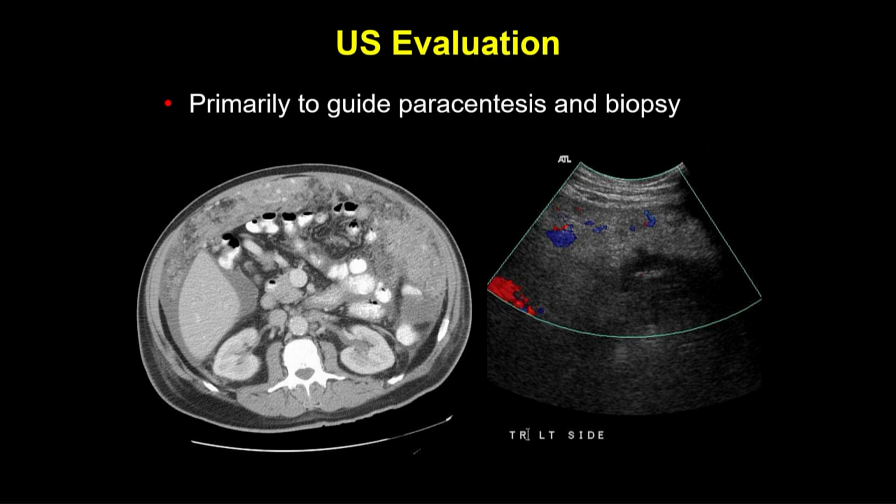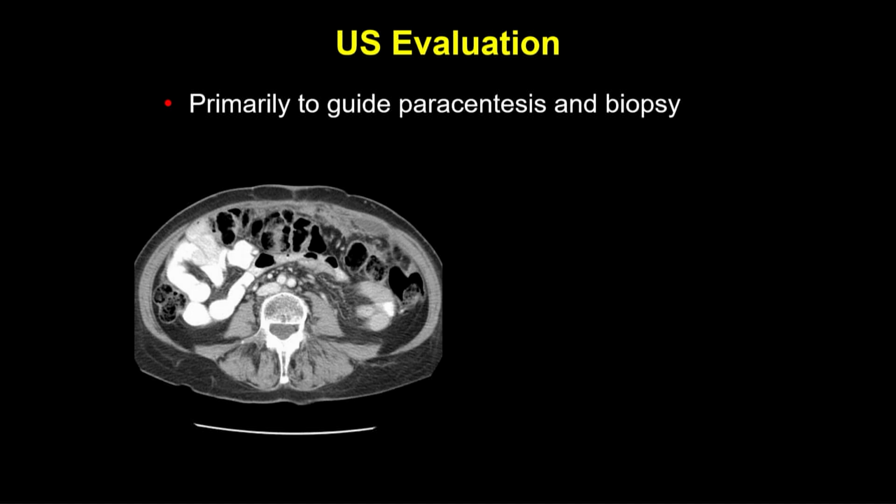And I'm basically showing this because we use the CT to guide the ultrasound where to go for biopsy. We sometimes have to use landmarks because you have to be comfortable. Sometimes the sonographer will come back to me and say, oh, I didn't see any tumor. But they're really just not seeing this uniform. You really have to figure out what layers you're looking at, and it can look isoechoic to things like intra-abdominal fat and so forth. But if you really use the CT as your landmark and decide, let's look here, yes, that thickening is the caking.